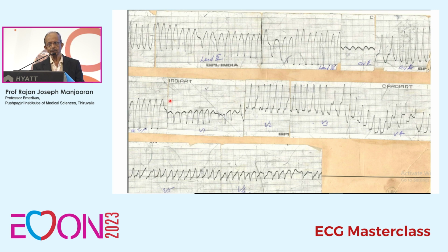What is this? Little more difficult. Is it regular or irregular? It is irregular, and it is irregularly irregular. Commonest cause of irregular rhythm is atrial fibrillation.